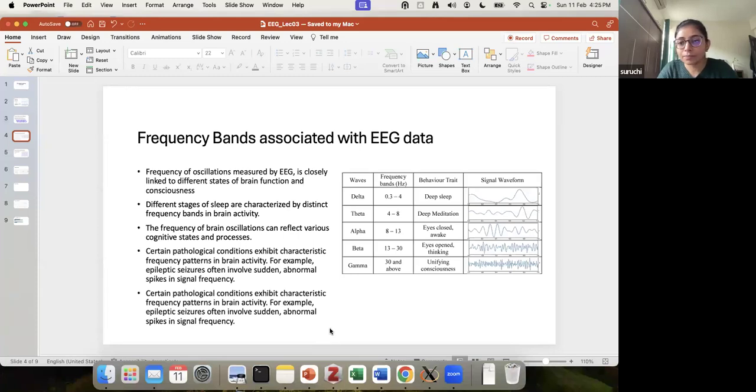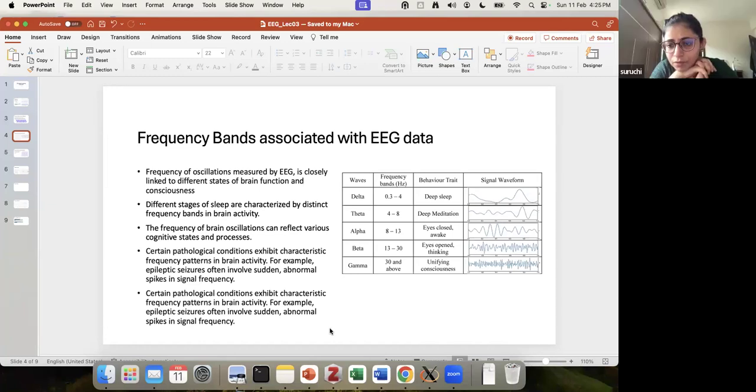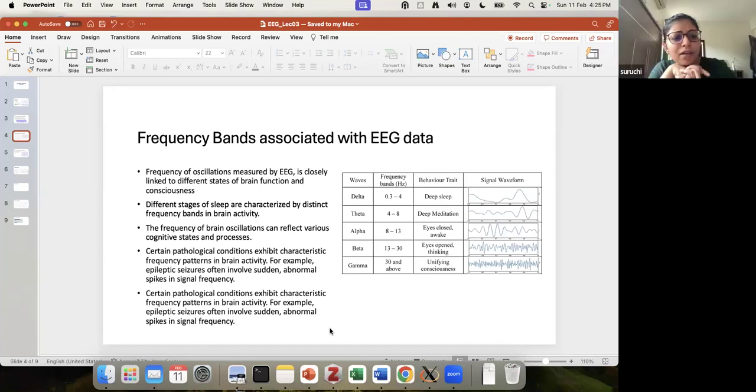By looking at the EEG data, can we say that this is delta or theta dominant at the moment? Is it possible? How can we count the number of peaks? Because the data is not telling for just 1 minute or 1 second. No, you can parse it for 1 second. You can look at a 1 second window and see. That's exactly what doctors do.